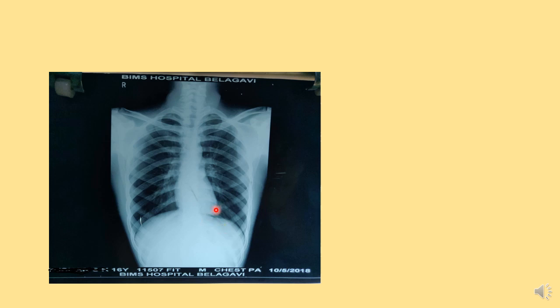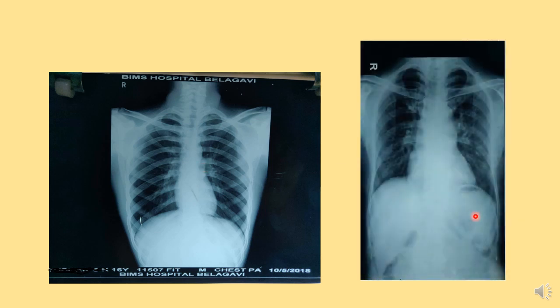This is the apex of the heart, and you can see this aortic knuckle, which is because of the arch of the aorta, which is turning and going back and down and to the left. This is one more cardiac shadow, dome of the diaphragm right and left, and this is fundic gas. These are some gas in the intestine or abdominal cavity. This is the tracheal shadow, both lung fields, clear lung fields, hilar shadows, clavicles.